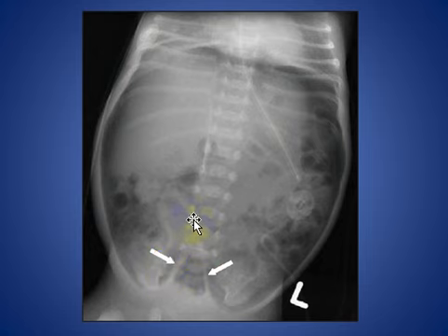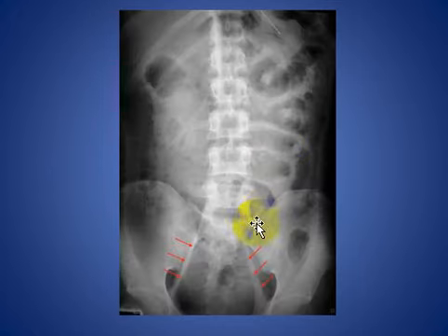Here it is connected to the umbilicus, and these are the lateral umbilical ligaments giving the inverted V sign. And also, as we see, a football sign in this patient. Also, another example of the inverted V sign. Here, the lateral ligament is outlined by air in this patient.